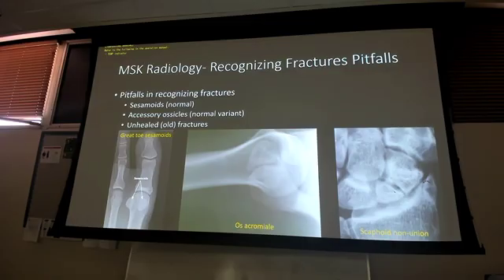Because what will happen is if you don't ask those questions, you'll be like, oh, found it, shiny toy. It's not even why they came in. That was from 2 years ago. It just never came back together again, right? And that can happen just about anywhere. It's just the scaphoid picture is the one that I have here. And we'll talk about non-unions a little bit later and kind of what they look like. So, don't let those guys trip you up.